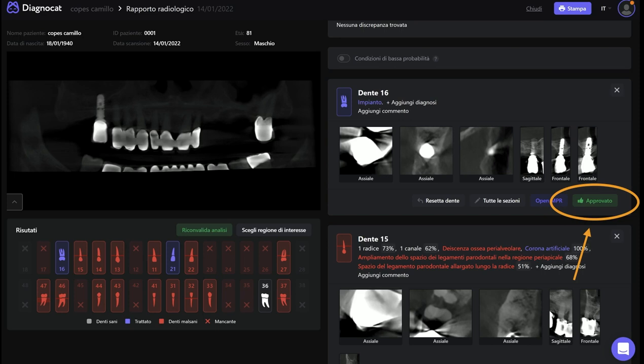I have to say that I have been using this software for a few months, and very rarely you can find a mistake, even in very complex cone-beam computed tomography, like in the case where a special algorithm for the reduction of the metal artifact has been applied, and also we have several metal crowns, and the 3D reproduction is not so easy for the reconstruction software, and is not easy at all for the artificial intelligence.